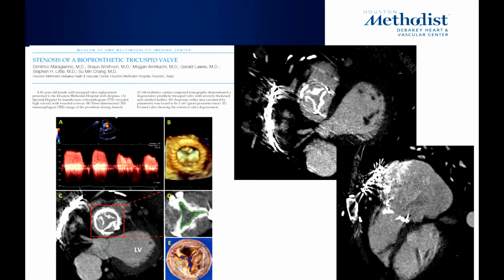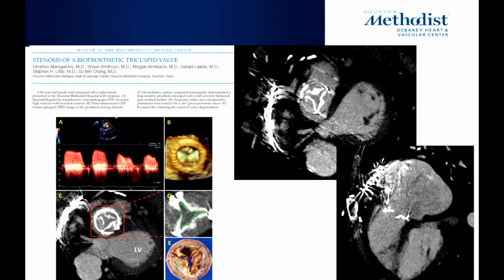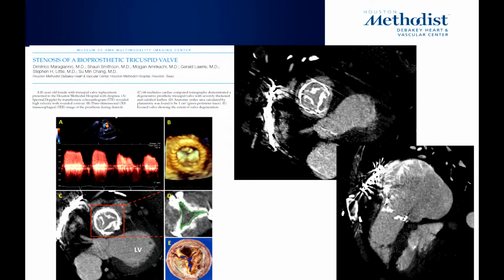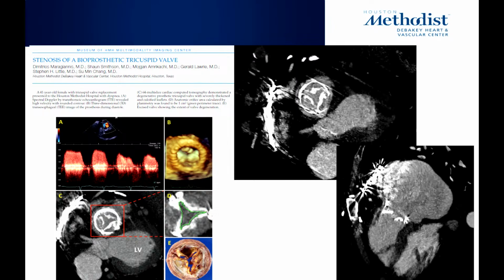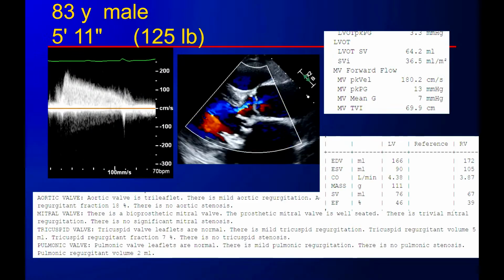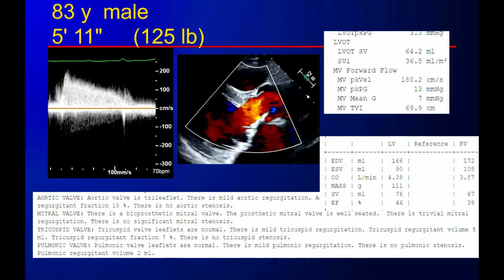So for bioprosthetic valves, I put in a tricuspid valve here because this is a very dramatic case. Cases like this don't require too much expertise to interpret. You see a very calcific, very degenerated, basically immobilized valve. So you have stenosis and regurgitation, high gradient, and so this is easy. This is a case that Dr. Q here and Carlos here just presented.